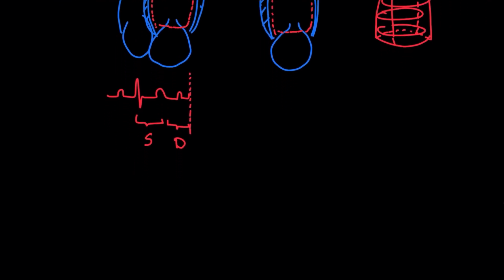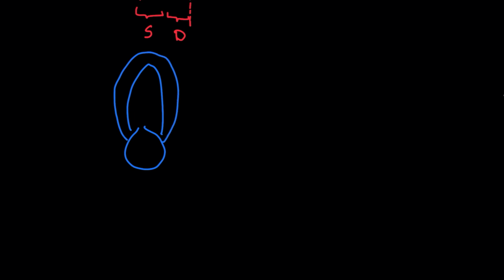Well, that's end diastole. What about at end systole when the chamber is at its smallest? So again, let's look at our apical four-chamber view. So the left atrium empties blood via the mitral valve into the left ventricle. And now the muscular wall is much thicker because we're right at the end of systole. So this is the muscular left ventricular wall. And if we were to measure the volume here, the heart has pumped out most of the blood that was in it, right? So this area will be smaller.